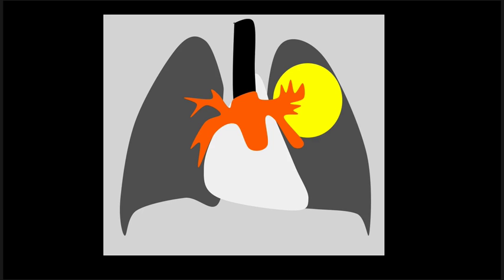So let's go back to our radiograph here, and let's see if we can find some of those interfaces. So there's one there, right with the heart. There's another interface here with that pulmonary vessel. We can sort of trace the outline of the mass. So there's several interfaces there.